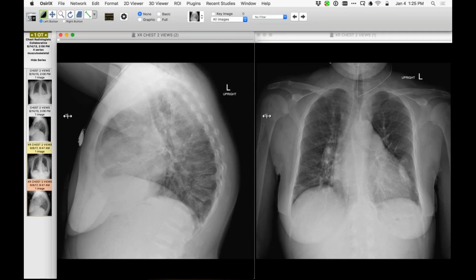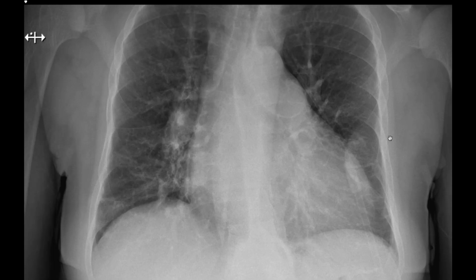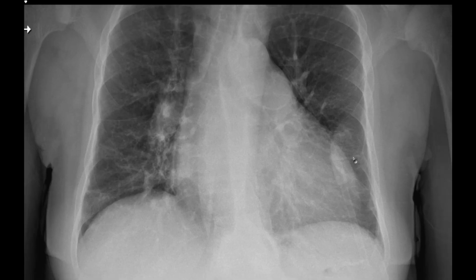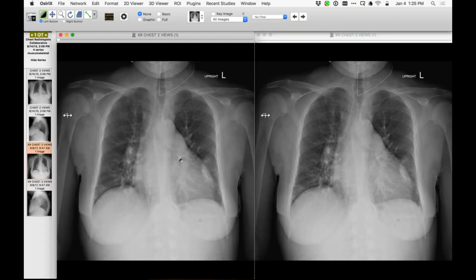It looks as if there's an expanded, though, lytic lesion in the rib, the posterior rib. I'm not sure yet. Yeah, I thought you were going with brown tumor. Oh, I don't really know. I'll have to look some more to see if I can tell, but that's a good thought. And I should try and look at the rib to see if there is a brown tumor of rib involving the anterior or posterior. That's a good thought. I wonder if that one posterolateral rib is no longer visible, whatever that is, 3, 4, looks like 8.